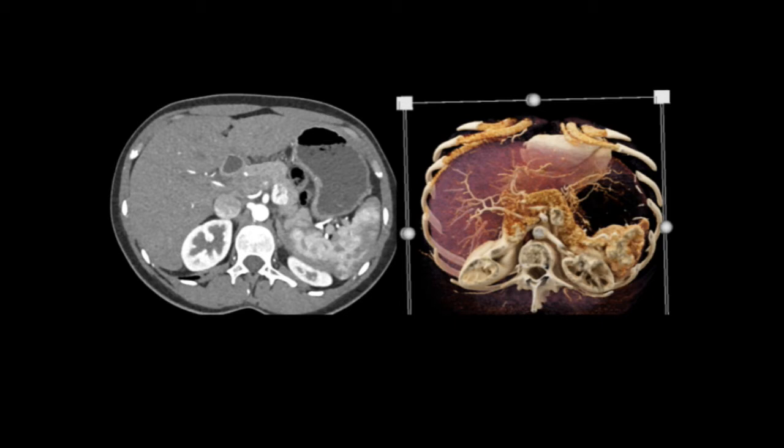Well, when you have hypervascular pancreatic lesions, I'm always thinking about a neuroendocrine tumor. If the patient had a nephrectomy for renal cell carcinoma years before, you could think about a renal cell carcinoma, but metastatic to pancreas, but that's about it. So I asked the best diagnosis. Adenocarcinoma is typically hypodense. Neuroendocrine tumor, that in fact is the right answer.